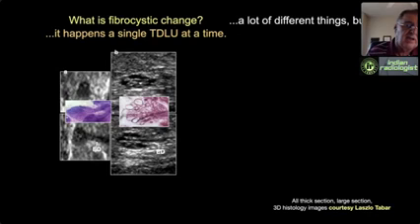In fibrocystic change, what happens is the acini become fluid distended. So I can see 1, 2, 3, 4, 5, 6, 7 fluid distended or cystically dilated acini. And I see the extralobular terminal duct and the intralobular terminal duct in the center. And then the normally loose gray stromal tissue becomes abnormally white. That's the fibro part of fibrocystic change.